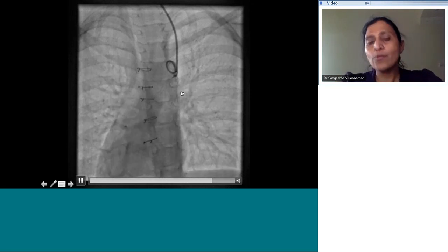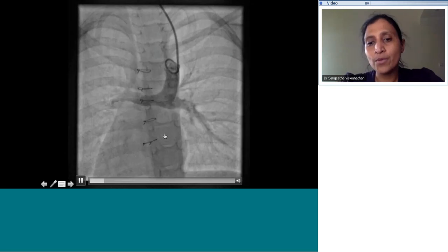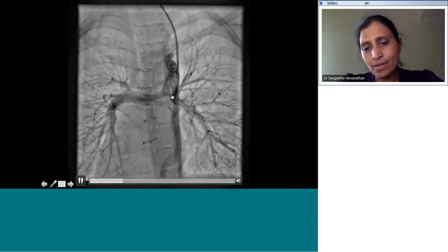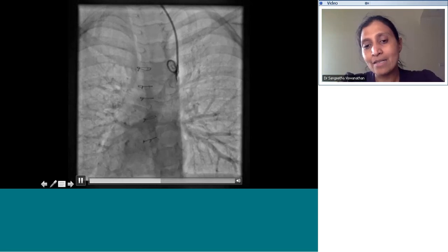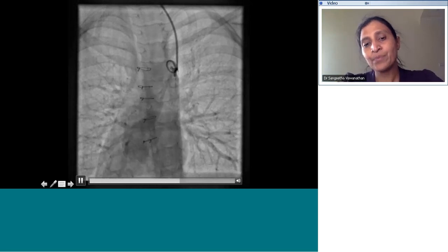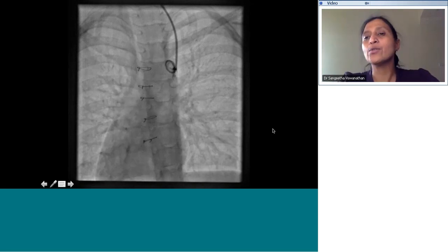In addition, you also see venous collaterals. This is very common in a post-Glenn type of scenario. This is actually something like the paravertebral plexus that seems to be filling up. And there's nothing that you need to particularly do about this.